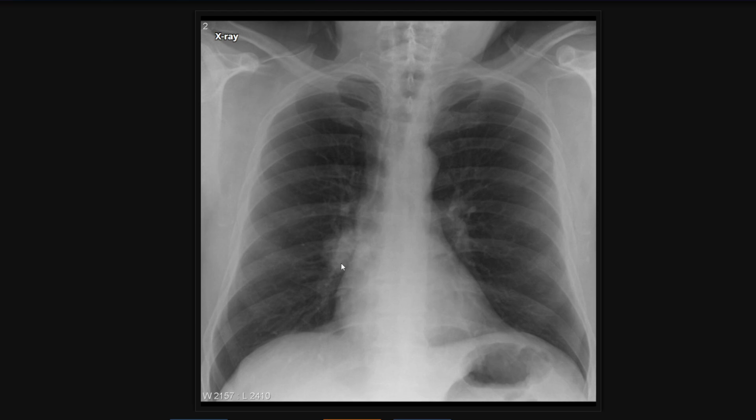without affecting the hilum itself. And if you recall, the hilum is composed of many pulmonary blood vessels that are branching out. So if the hilum is intact, but we have a nodule within the area, then this is known as a hilum overlay sign. A hilum overlay sign just tells you that we have a lesion that's not within the middle mediastinum, like hilar lymphadenopathy. It's a lesion or a nodule that is either anterior to the hilum or posterior to the hilum.